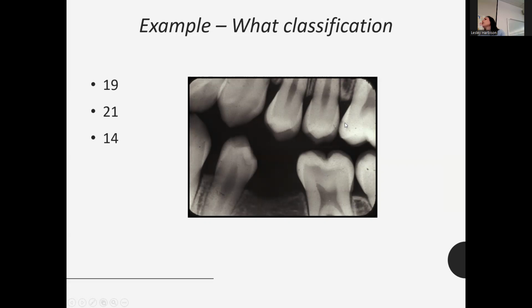You can see, it's hard to tell. I know these are never as good as what you'll see in Axiom, but to me, I feel like it comes maybe out to here, which might be a little bit more than half. So it might be moderate, but you know, I never say 100% definitive. You kind of have to pick a camp, and I would probably pick the moderate camp, but I do see that here is where the darkest ends, but then it's a little shadowy further in. But definitely it's not in the dentin, which is what you really want to notice.